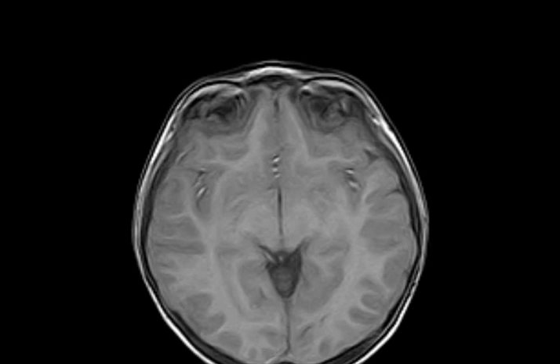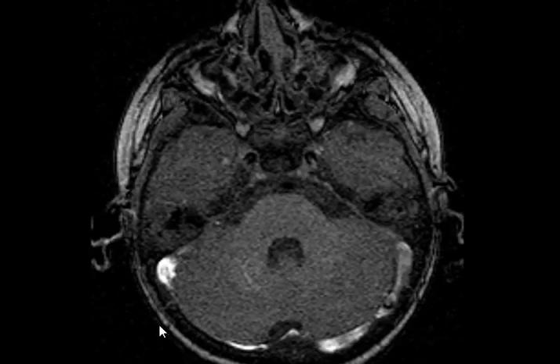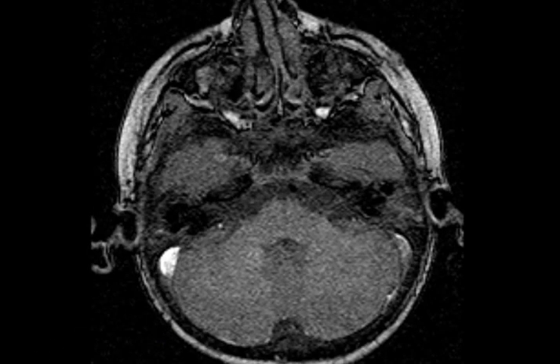Exactly. We should look for other lesions. Intracranial looks normal. So, what would you do next? Next, we will go to the post-contrast. Contrast. You give contrast. Okay. Let's see if there is any contrast. Try just a second. Wait.